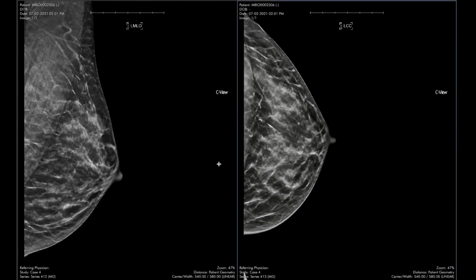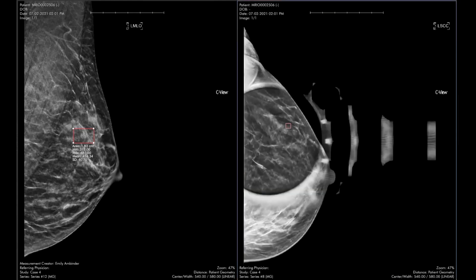This is a companion case to the last case, another baseline screening mammogram, woman age 40. And similar to the last case, we saw an oval mass. This is in the upper outer left breast. So also like the last case, this was given a BI-RADS 0. We had the patient come back for additional images, specifically spot compression images.